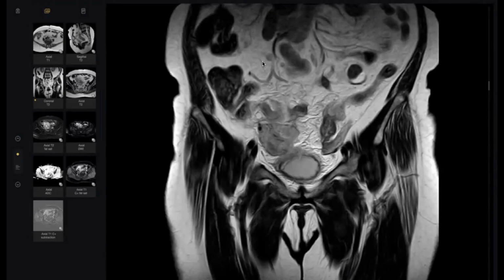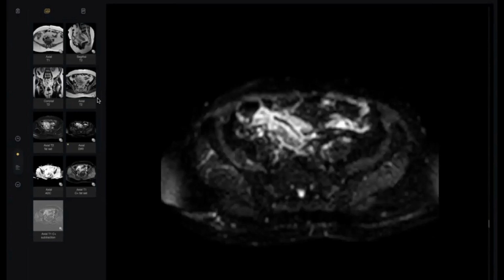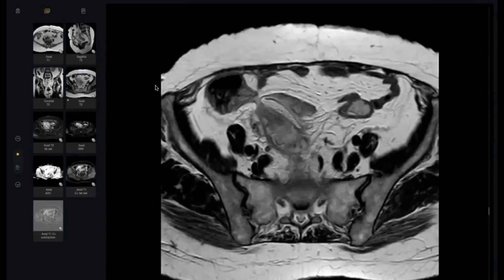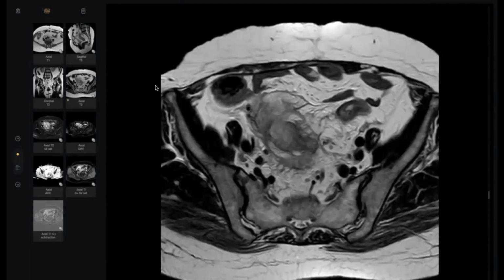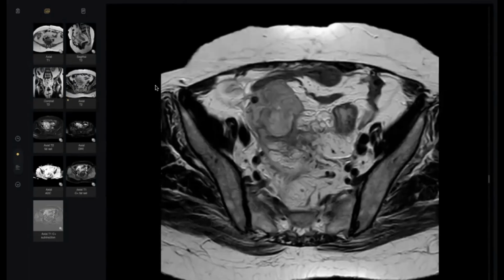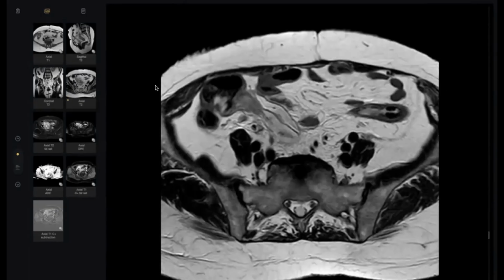In this case, urgent surgical referral is indicated, or maybe a drain can be placed if there is abscess collection. I'm not an expert in intervention, but if this is perforation, I think it requires emergency surgical referral. Yes, it needs a surgical decision rather than interventional because it is perforated and there is a localized abscess.